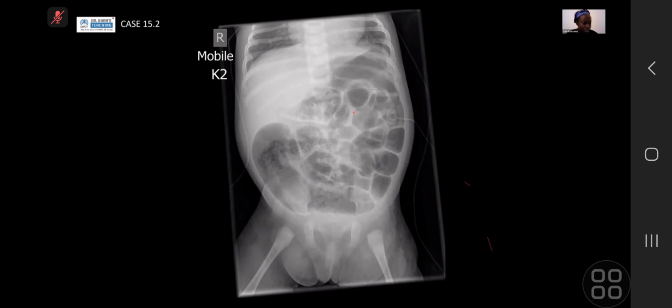Moving on to the next case. Here we can see the mottled lucencies suggestive of NEC, and there is no portal venous gas, you're correct, and there are lots of dilated loops. But up here, you've got this weird triangular lucency in the upper abdomen, and this is where your pneumoperitoneum is. The bowel does not make triangles. So if you see triangles of air in an abdominal radiograph, it's pneumoperitoneum until proven otherwise.